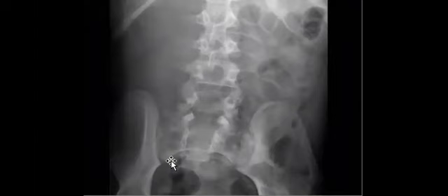So what do you think it can be in a pediatric patient? Mass lesion compressing the bowel to the left side: neuroblastoma, Wilms tumor, hepatic origin neoplasm. Hydronephrosis. Yes, nice. Good differential. Then associated with the skeletal abnormality. What? Sorry.